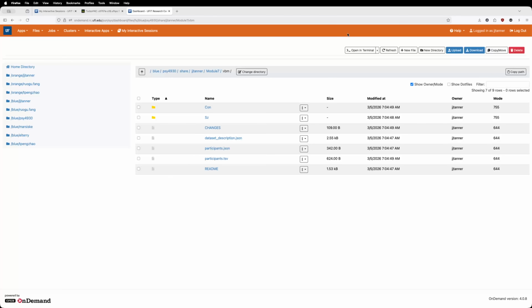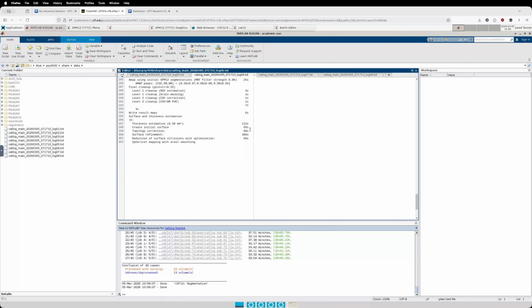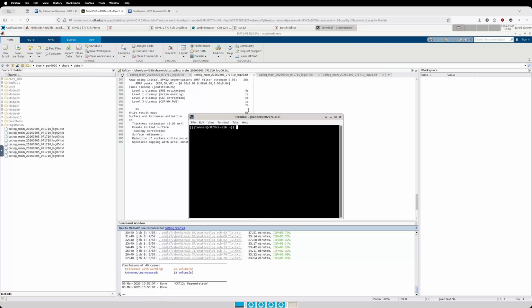And so I'll come here, open in terminal, and we'll see if this works. It wasn't working for me earlier. And in that case, yes, not loading. So what I'm going to do is use this window. Over on the MATLAB tab, under Applications, XFCE Terminal, open that.